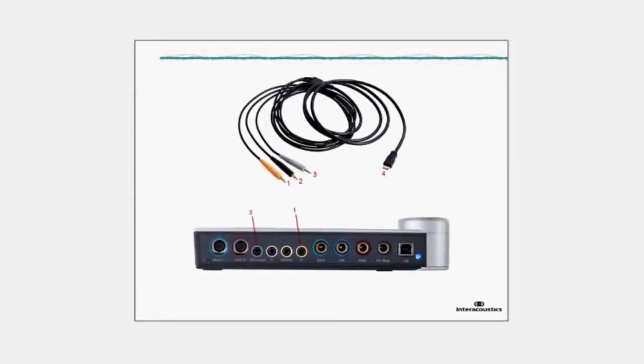It can be connected to the Callisto in a similar way to the coupler base. So as you can see in this image here, we have a connecting wire with jack 1 plugging into the free field output and jack 3 plugging into the talk back and coupler mic. Jack 4 plugs into the back of the TBS-10, and jack 2 I'll explain in a moment.